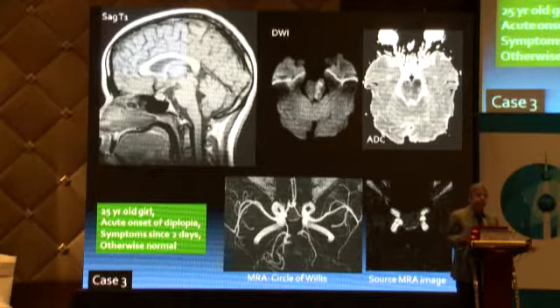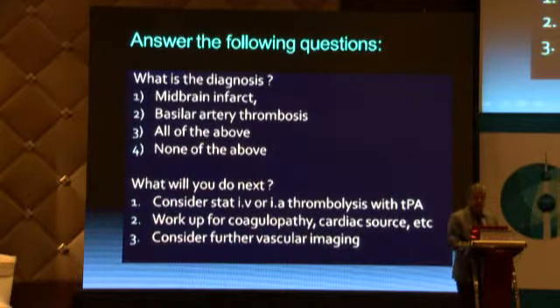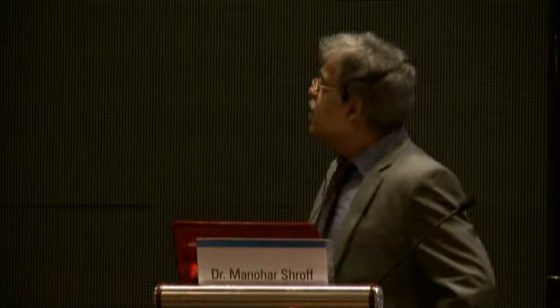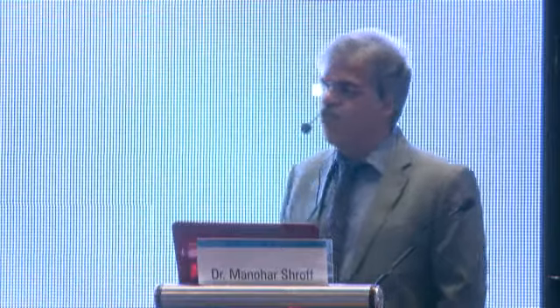And this girl was otherwise normal except for diplopia. She came in walking into the MR. I still remember her name because I so vividly remember these interesting cases. So let's start. Just answer the first question. The second question I'll answer for you. So take your remotes in your hand, be ready, and you have 15 seconds. Let's see that everybody gets an answer over here.